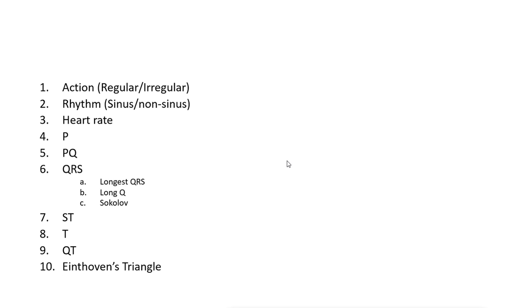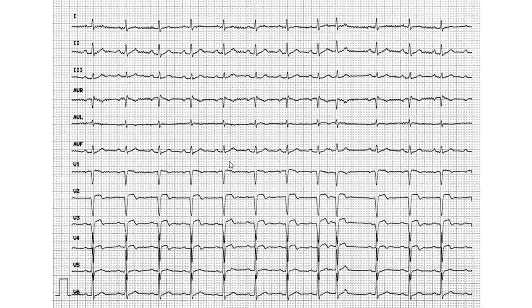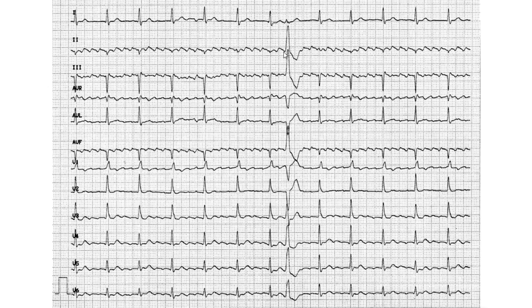Extrasystole, by definition, is extra, and it is not representative of the heart's general activity. You don't base your answer upon it. It is its own case, just leave it on its own. So an example would be, let's look for an example. Yeah, like this one.